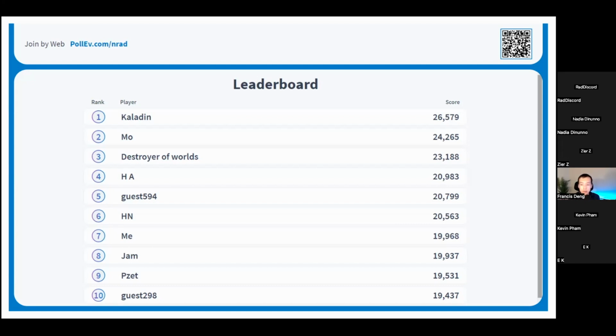Can you have calcifications in hemangiomas? Sure. But when I see a masseter lesion with phleboliths, I'm going to think of venous malformation.